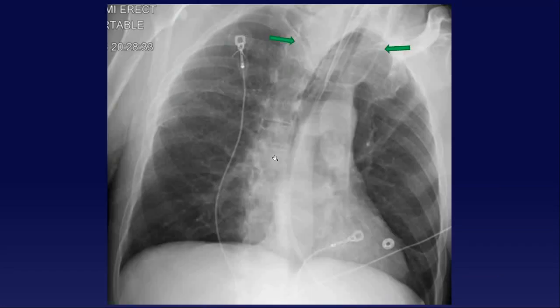Quick question, Dr. Auffermann. Sure. These ones that are making the U-turns and looping around, those are placed correctly, right? So this is just the most preferred route for placement? No, these are all incorrect. Every case I've been going over has been incorrect? They're all abnormal positionings. You definitely want the catheter tip to be in the superior vena cava. That's the only place you want it to be. If catheters are in other locations, they should be repositioned.